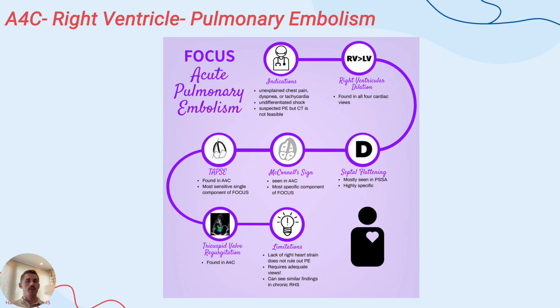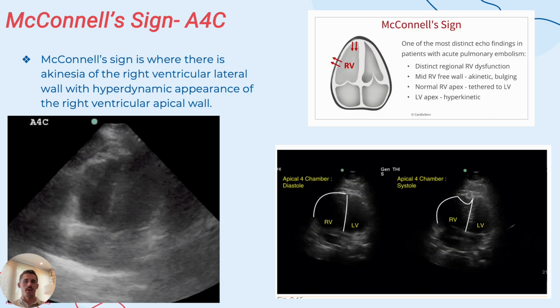Again, all of these are if this is your resource and maybe you don't have a CT there, or you just have ultrasound at the bedside and you'd like to get more confirmation of something before going to CT and additional intervention. So, McConnell sign.